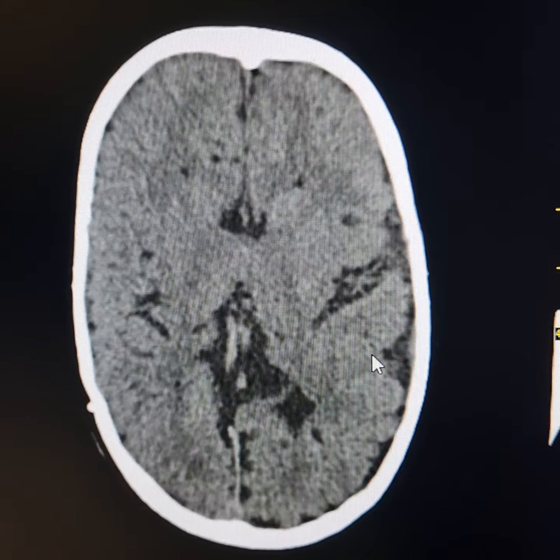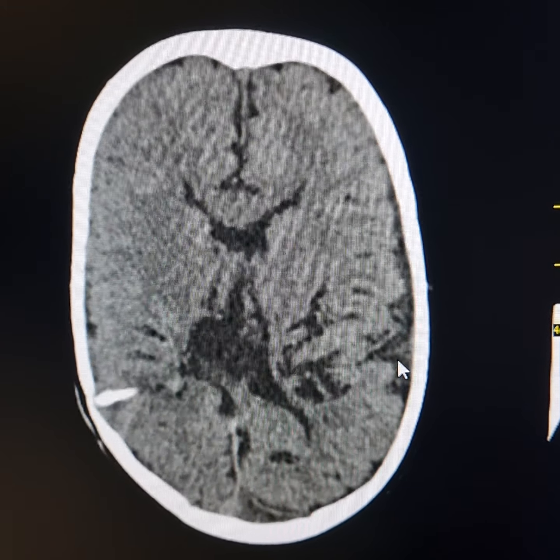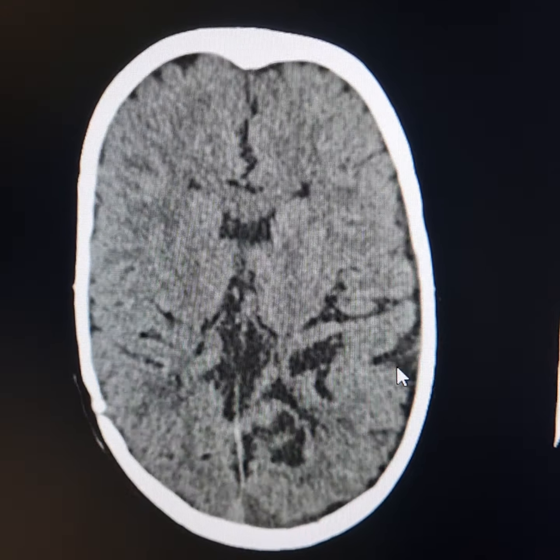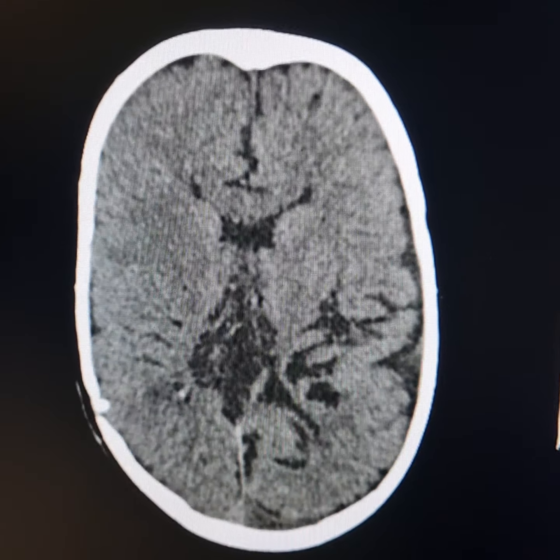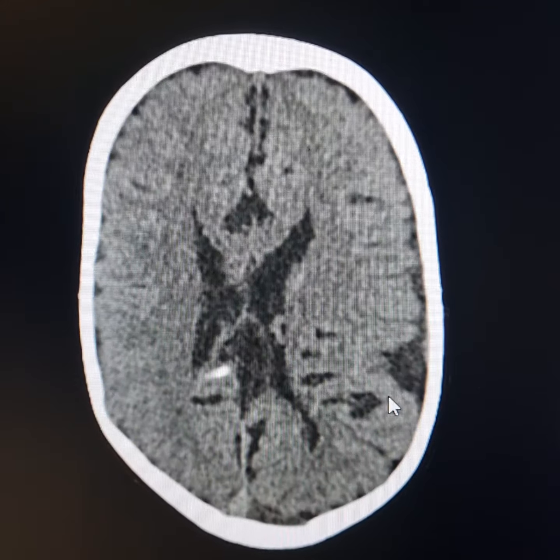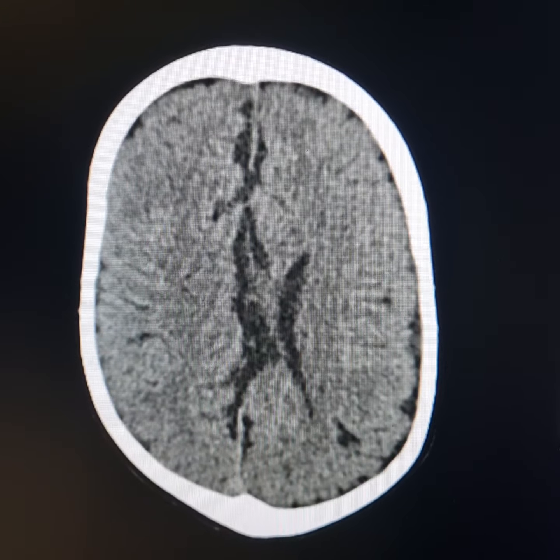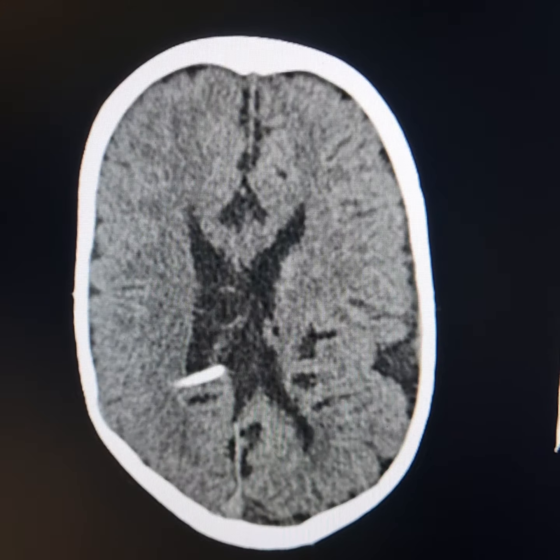Now please observe dilatation of extracerebral CSF spaces in the parieto-occipital region. This is suggestive of residual effects of previous ischemia. Thickness of white matter is reduced. This is because of the presence of previous hydrocephalus.